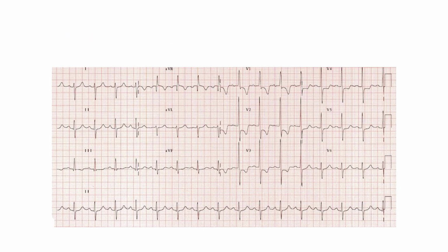So shown here is a complete 12 lead ECG along with a rhythm strip of lead 2. At the extreme right, you can see a box which is called as calibration signal. It indicates the paper speed as well as the voltage.